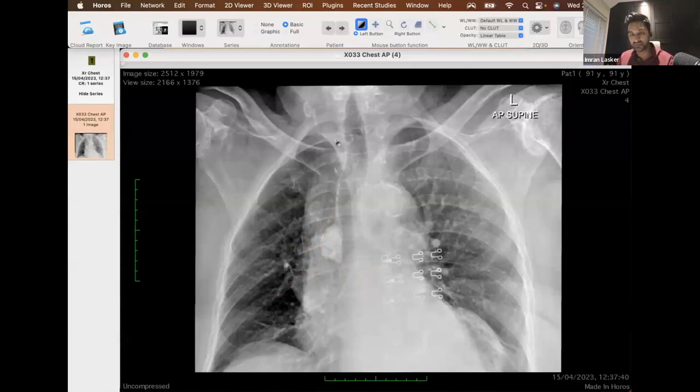Now, it's really important to quantify that the patient is rotated, because I've too often seen people start worrying about this area over here. You have to understand that as people get older, you do get some very normal apical scarring on both sides, especially when the patient is slightly rotated. You're going to have an abnormal looking appearance to the apices, with overshadowing from the soft tissues of the neck, the chin. So always quantify the limitations of your study. If they're rotated or kyphotic, then say that, because then you understand there are going to be some limitations to your interpretation, right?